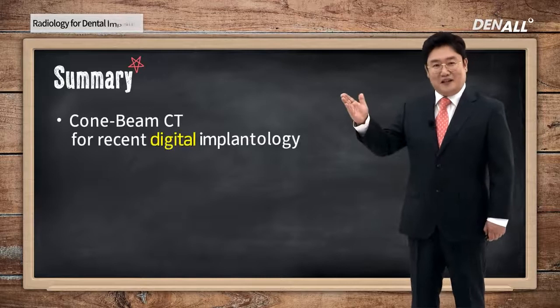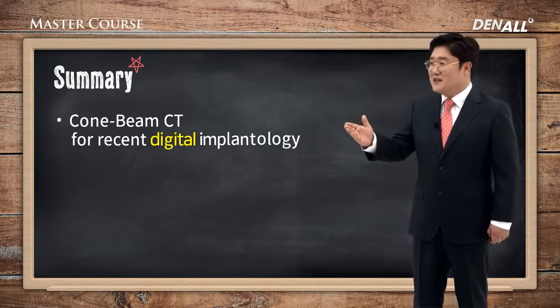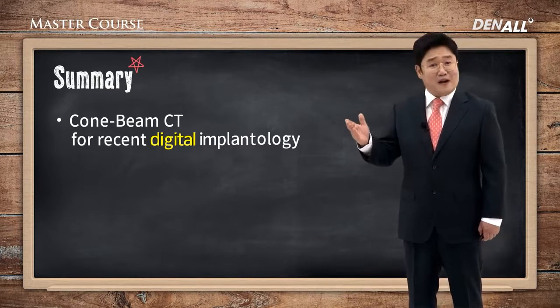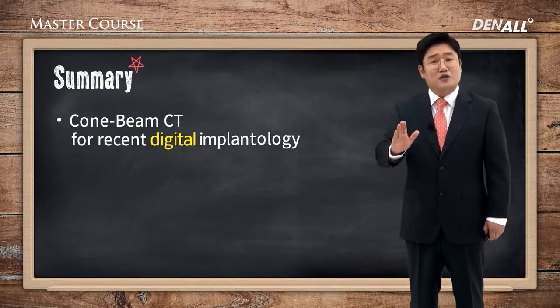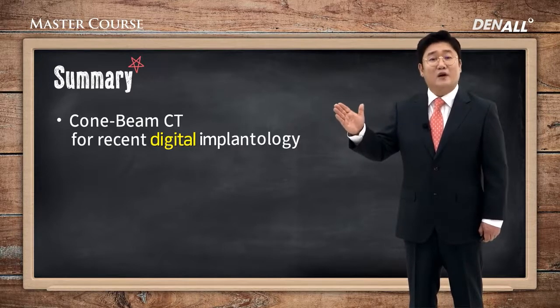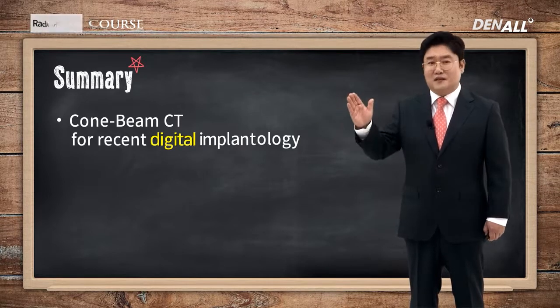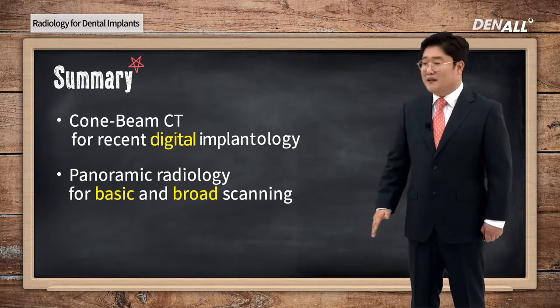Cone beam CT, CBCT, or dental CT is the recent digital trend, absolutely necessary for digital dentistry. It helps for accurate surgical planning, and the surgical outcome can be accurately identified using CBCT. Without CBCT, we cannot talk about digital.